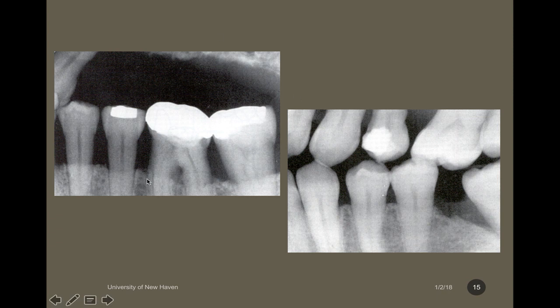I'm definitely assuming that this is some pretty advanced bone loss. I mean, look how much bone we've lost here. We have some furcation involvement as well. But as we said before, we can make a full diagnosis, I want to see what my clinical examination is. Do I have bleeding on probing? Are my teeth mobile? I want to know things like this.